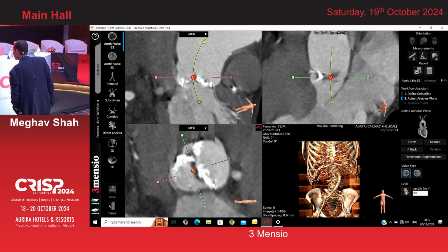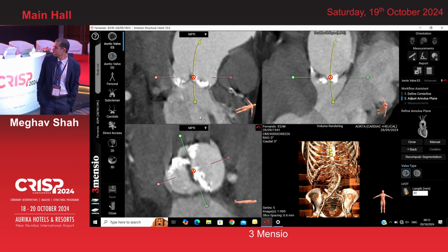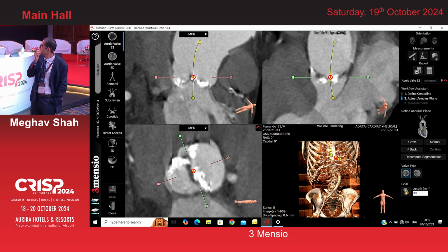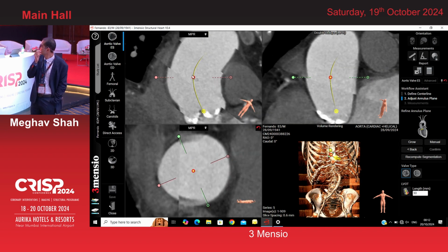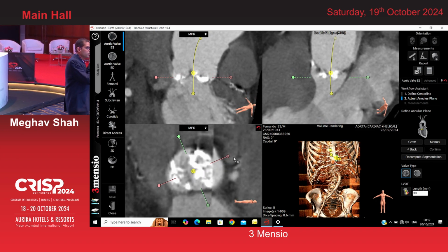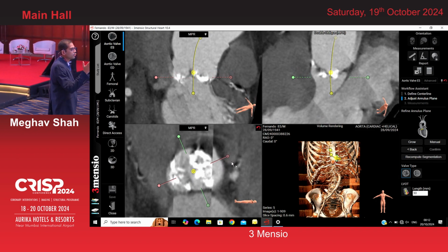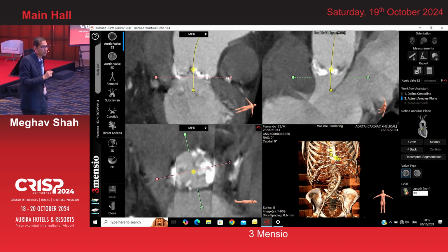Okay. So no raphe, a lot of calcium, type 0 bicuspid. You can see there's a lot of calcification on the leaflet. Just show the annulus fast. Over here, so usually in bicuspids it's very difficult to get the coplanar view, because instead of 3 cusps there's just 2. So you have to imagine there's a third cusp and then place the dot over there.